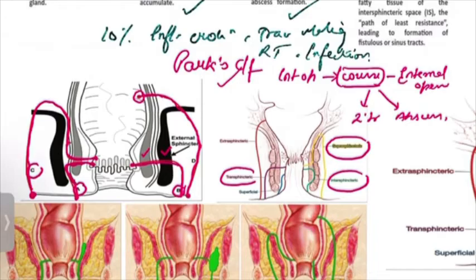As this fistula doesn't cross either the internal or external sphincter, this is known as the extrasphincteric fistula, okay.